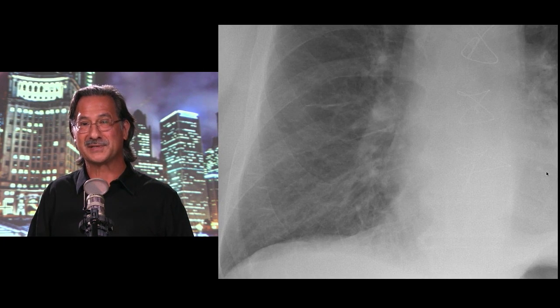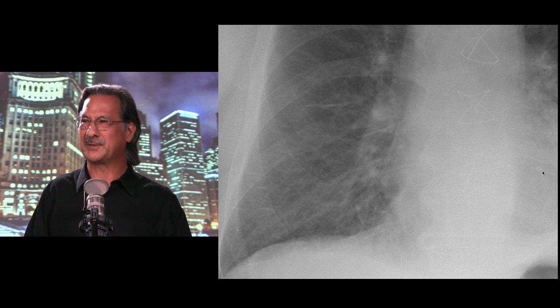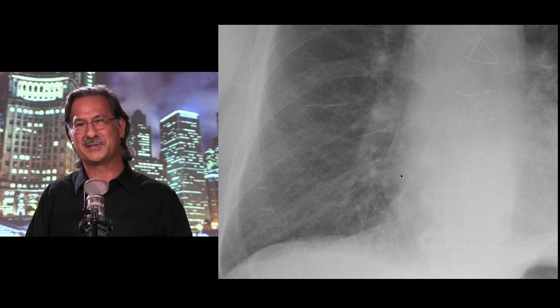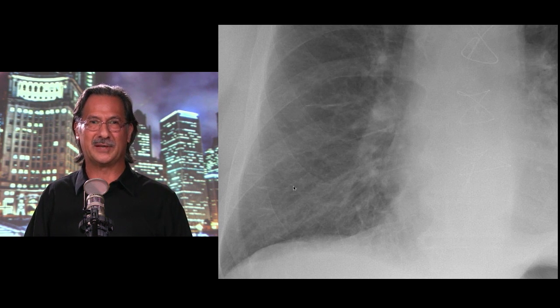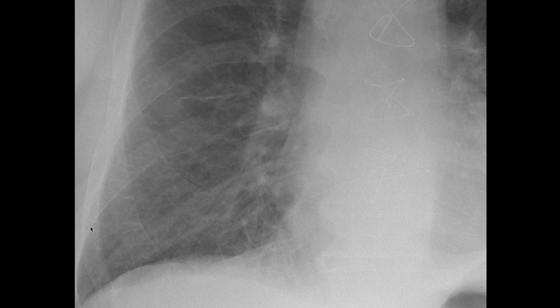The other thing that we see too is accumulation of fluid in the septa in the lung. Interstitial, so we talk about these Kerley B lines. If we take a look off in the periphery, in fact, it's subtle, a little bit hard to see, but we see almost these horizontal lines at the periphery. Right. Yeah. So fluid accumulation in the interstitial tissue. Those are the Kerley B lines that we can make out. I could never figure out Kerley A lines and Kerley C lines, so I'm not even going to talk about those. Kerley B lines, they're good enough.